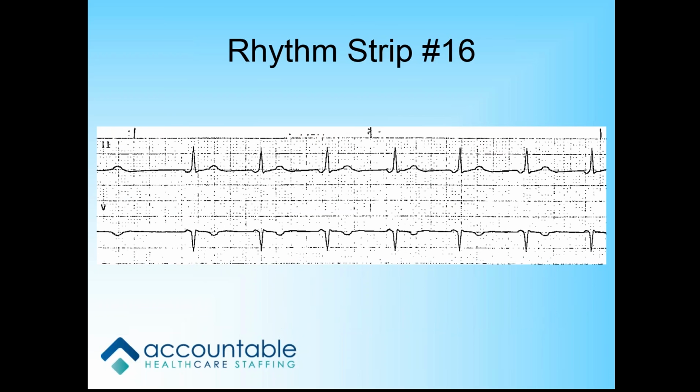Amanda, I haven't called on you for a while. How about if you take this one on? That'll be great because I have some questions on this one. There is a P, but it's barely there. It's really close to the QRS. The rate is somewhat regular. It's 70, and it's regular. And they look like they're inverted, kind of, on the top lead.